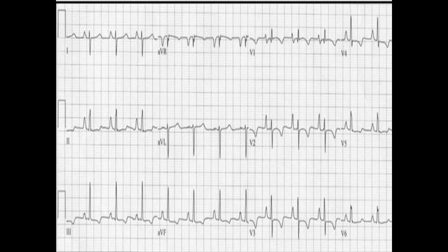And we're going to look for left atrial enlargement, which we don't have. I don't see any P mitral. Don't see any little notching anywhere in lead 1, lead 2. Now we're going to look at lead 2 and lead 3 for P pulmonale, peaked tall P waves, and we definitely have that in lead 2, big old P waves.